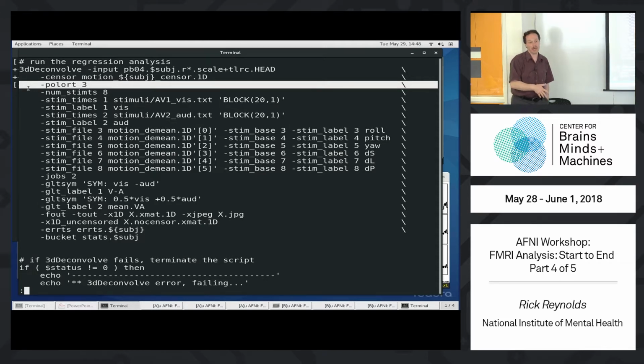And the 0.3 is the most conservative? 0.3 is a semi-random number that I threw in here for examples, but it seems like a reasonable number for healthy adults. For resting state analysis, the example uses 0.2 because motion is a bigger deal. But what should you use? It depends on your subjects. If you have good subjects, you can use a stricter level.